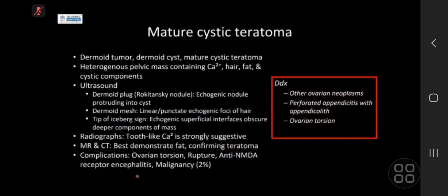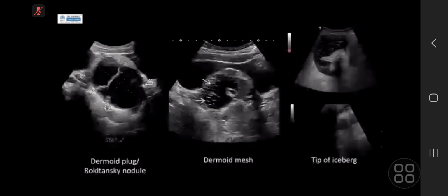Okay, I don't think the exam is going to give you that they've got encephalitis, but it's quite a cool thing if you were reporting in your pile, you saw this, and they said they had encephalitis, they could help you to say this is most likely to represent a dermoid. So like what I mentioned earlier, you've got other neoplasms that this could be different shows of, perforated appendicitis if you were just given a plain film, and patients at risk of ovarian torsion. Just remember, the teratoma is one of the most common ovarian neoplasms under the age of 20, so in young girls, in young ladies.